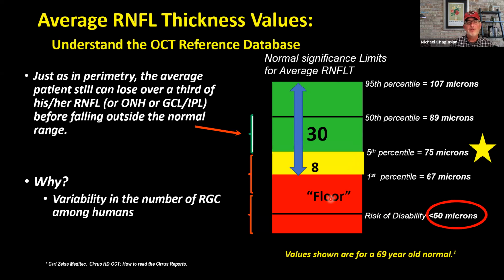And if you ever see a 0 for RNFL thickness on your OCT device, that means that the OCT did not segment the RNFL thickness, and it just gave you a 0. There's no such thing as a 0 reading for RNFL thickness.